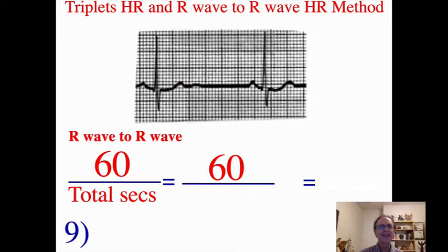Another one, number 9, class, triplets and R to R. You know, class, we do repeat a lot because EKG is a scientific language, and just like any language, you have to repeat. Okay, I'll start us off. Let's get our triplets going.